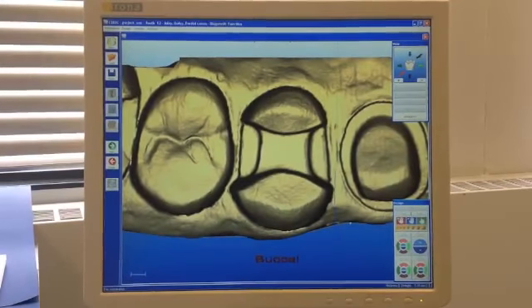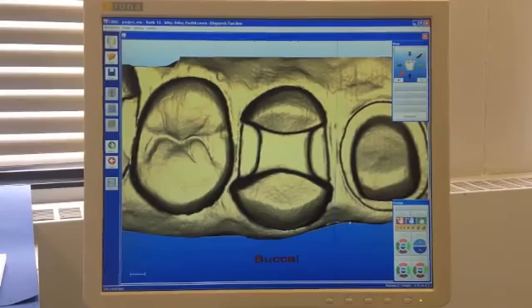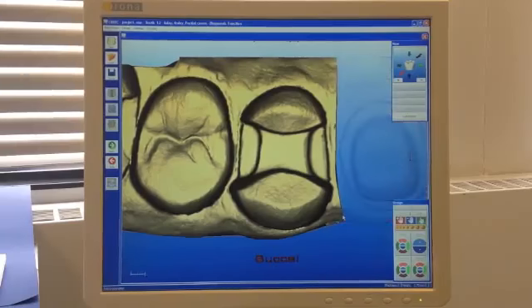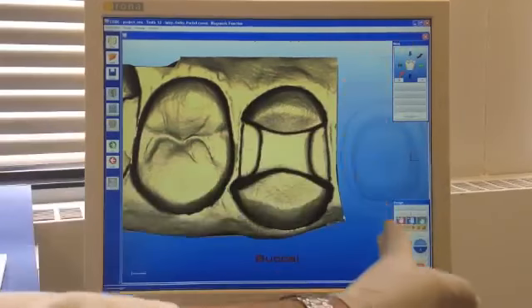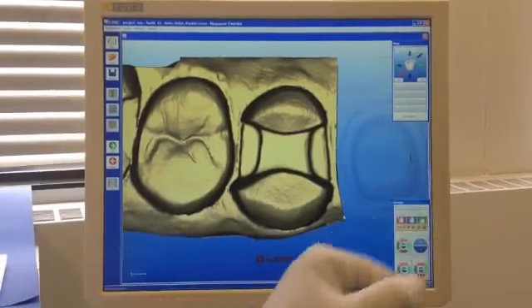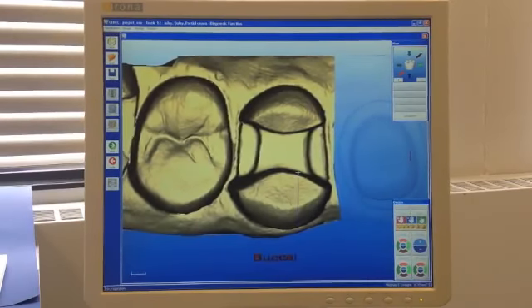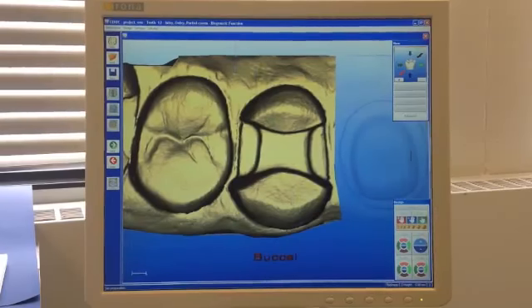If you want, during this process just do one left click, and once you reach the other area, double left click, and as you can see now the mesial adjacent tooth is gone. We are going to do the same thing on the distal.